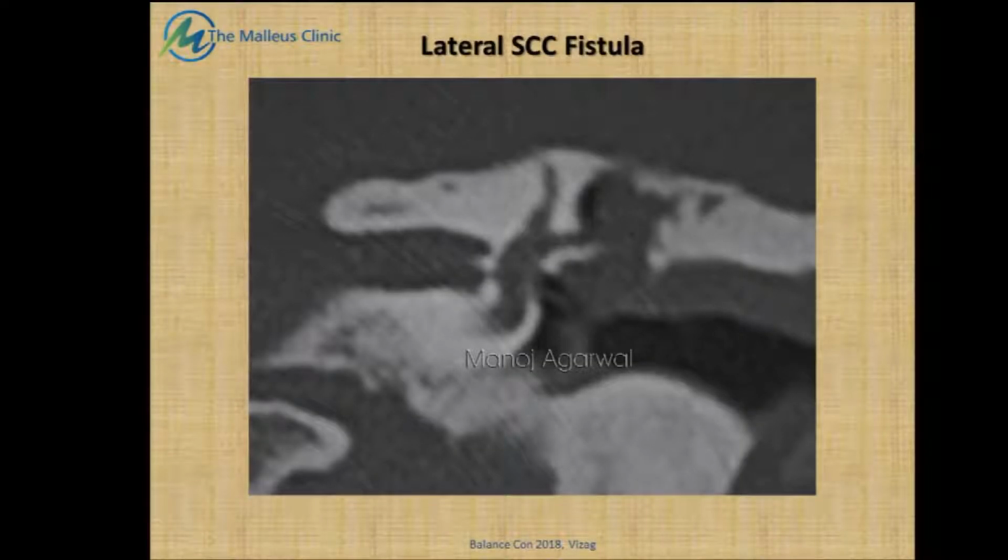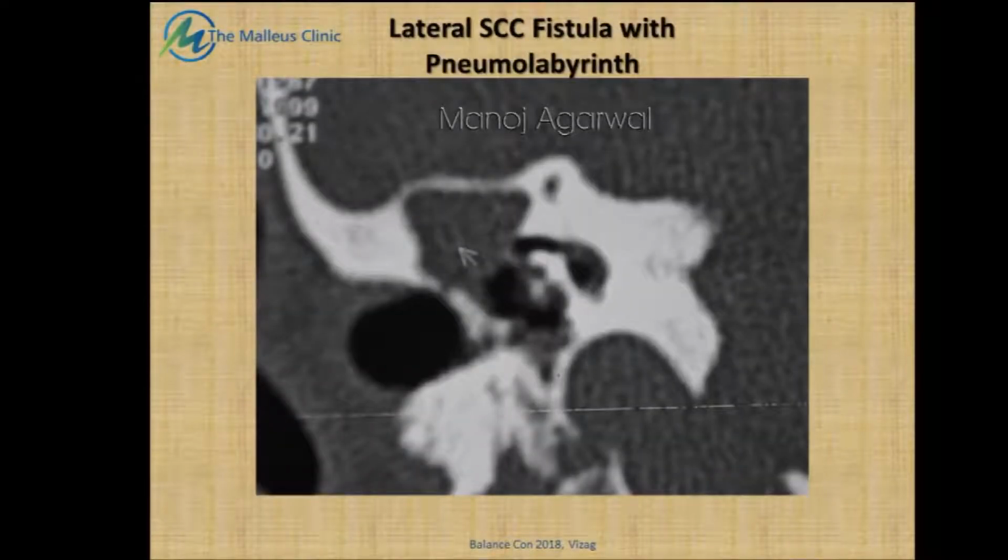But is it always the lateral semicircular canal which is affected? Not necessarily. But prior to that, what you can also find interestingly is areas of hypointensity within the vestibule. What does that indicate? That indicates a pneumolabyrinth, which means that the membranous labyrinth too has been compromised and an air bubble has actually entered the labyrinth, and these patients are more liable to have a sensation of dizziness. Aren't we taught that you take the facial nerve to be dehiscent and the lateral canal to be fistulous?